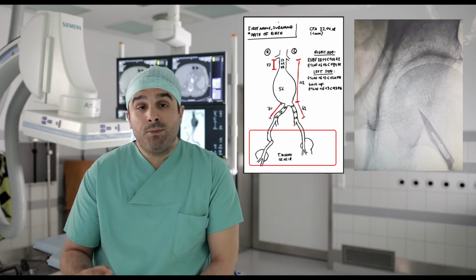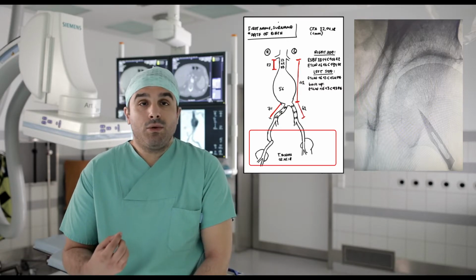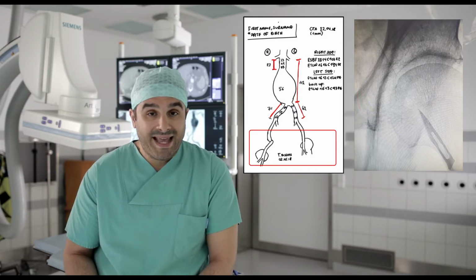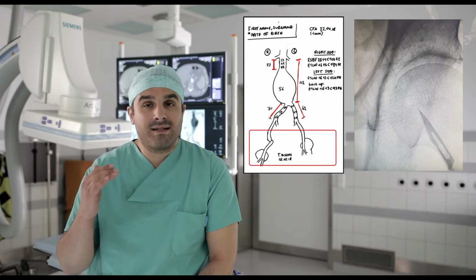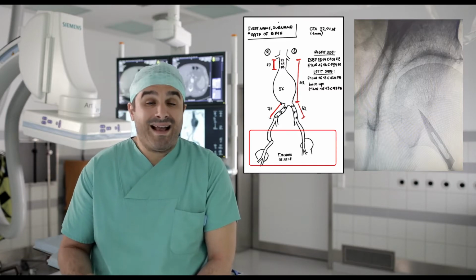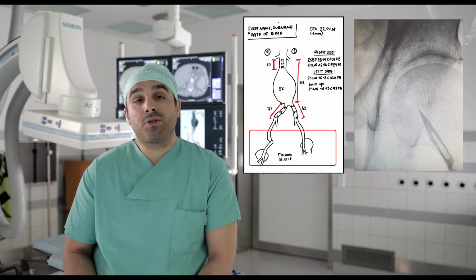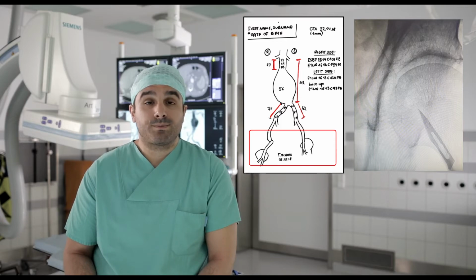The second important issue is to prepare your puncture site. This includes the location of the deep femoral artery in association to the femoral head. This is important to assess the exact height of your puncture under fluoroscopy and to prevent any accidental puncture of the deep femoral artery during percutaneous EVAR. Here it is also important to describe any challenges like thrombus, dissections, calcification, or stenosis.